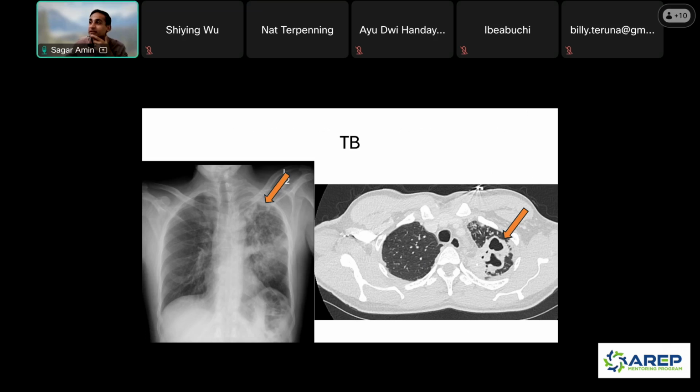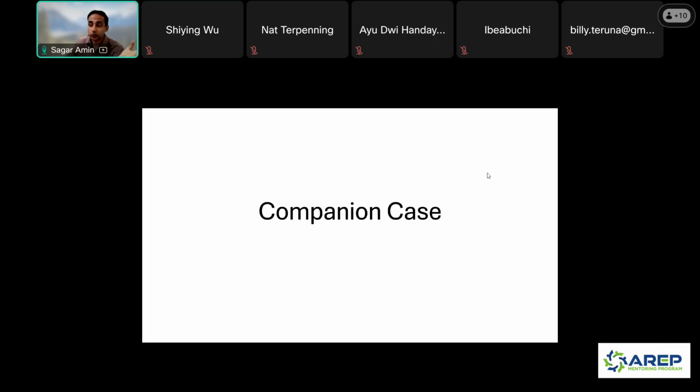Okay. Yeah, so in the chat, someone said pulmonary TB, and that's correct. The classic findings that we see on imaging is that usually there's a cavitary lesion with endobronchial spread of opacities, usually a post-primary type of TB. Maybe they had TB in the past and then it came back and reactivated. Now, there are different types of TB that we see, and a lot of it has to do with immune status. So I'll go through some of those.